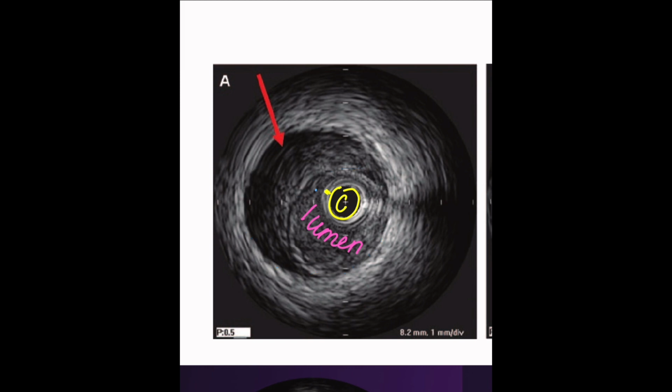Between the intima and the media, right? So what you have here is you have the intima, the media, maybe adventitia, not sure, right? But let's say intima, media, something going on back here, and then adventitia. So that is kind of where the dissection part comes in.